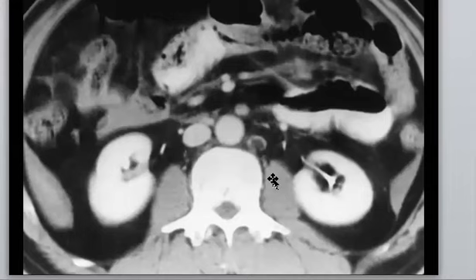Maybe, but I agree with you that this is not a very good window, but yes, there is something with the thickening in the bowel. This is a differential for misty mesentery. Nice to mention misty mesentery.